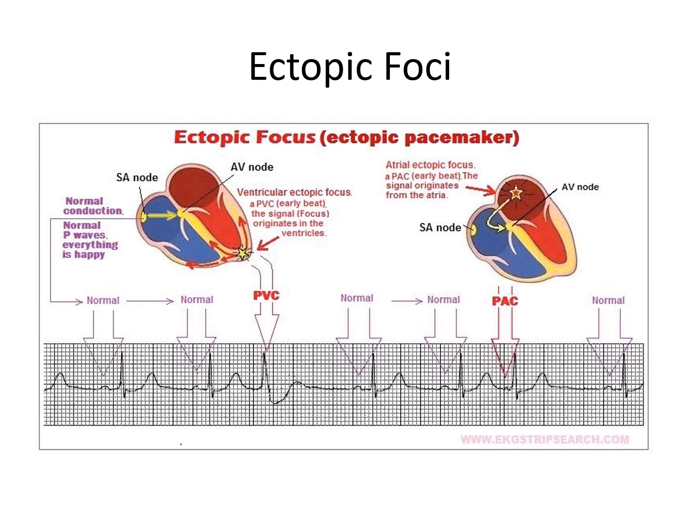Okay. The next picture shows an atrial ectopic focus by this other color star here, more like maybe a pink color. If it's in the atrium like this, it can cause an early beat as well. This one is a premature atrial contraction, which is what we see occurring here. So I hope that this brings a little bit of clarity to the topic of premature beats and ectopic beats.